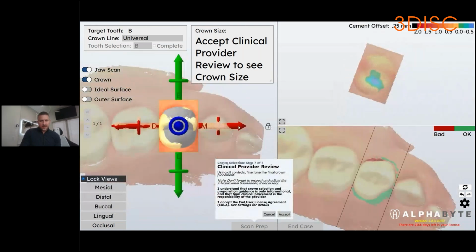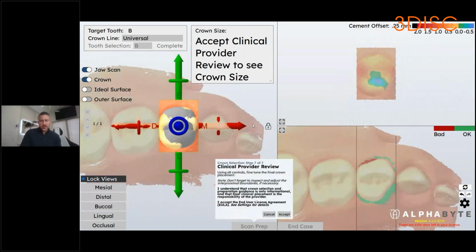And now we're at the final screen. And this is the screen to which an assistant can get you before you even sit down to evaluate it. While you're across the hall doing hygiene checks, the initial scanning, all the workflow overlay steps that you saw me just go through can be done. And this is the screen on which you can validate and continue to optimize as you see necessary.